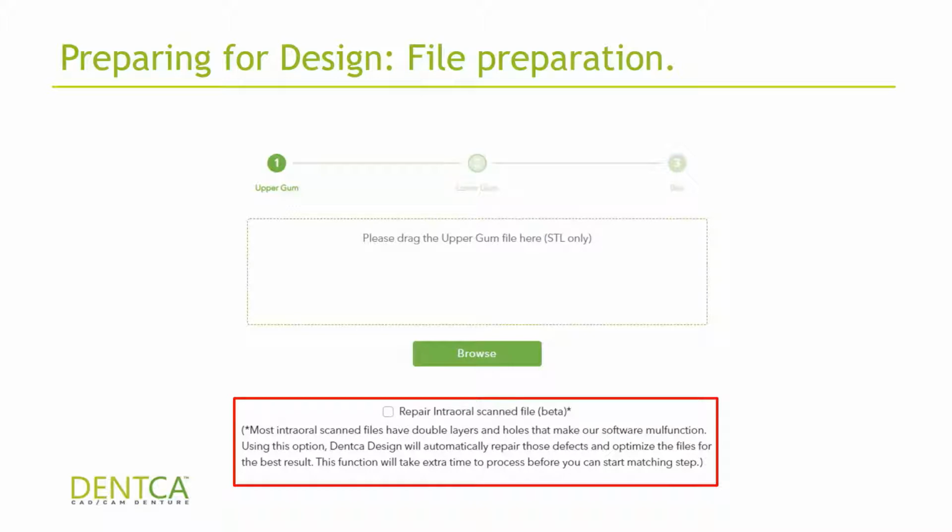My recommendation is try the beta first. If it resolves all your issues, you're good. Otherwise, take it to a different software and try it out. So in order to do this, once you start your order and you start a design on Dentca Design, you will get the file upload screen.